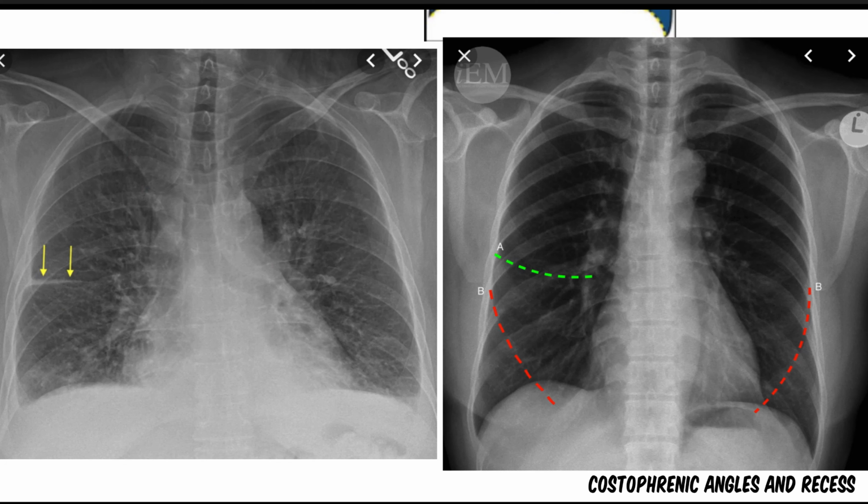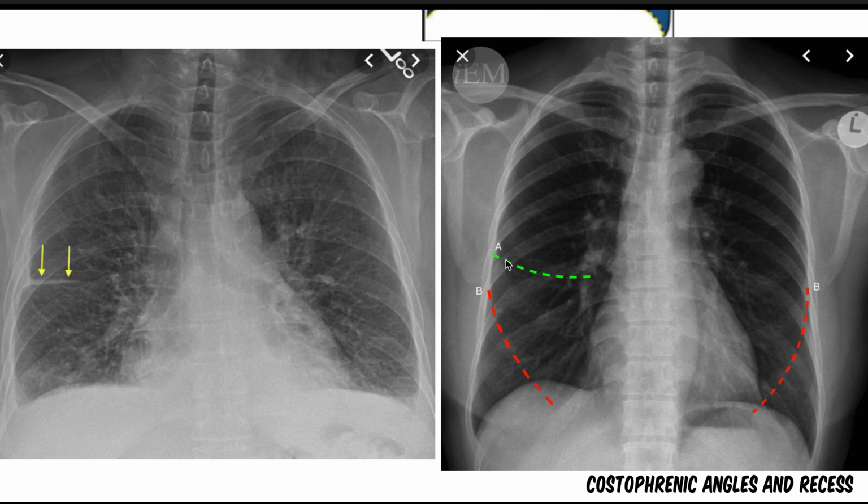So on this screen you can see we've indicated on the left here is the right lobe, the right lung. You personally know that the right lung has 3 lobes. So the upper lobe here, this is the horizontal fissure, and this would be the middle lobe because, as I said, it's closer to the right ventricle.